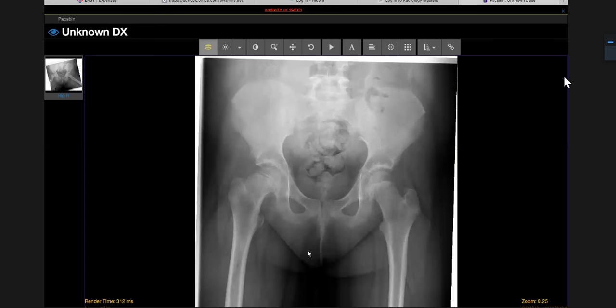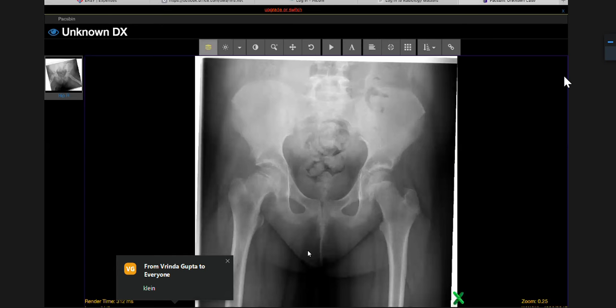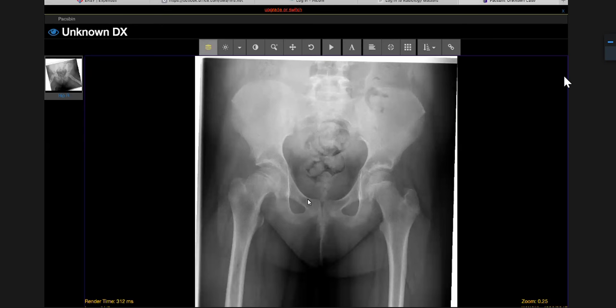If you look at the femoral head growth plates, do they look different? Are they a bit reduced in size? No, if you look at the right side, we've already decided that the abnormality is there. The growth plate there, where you're tracing, that is widened when compared to the left. And there is a bit of widening of the joint space as well. I think the joint space is okay.